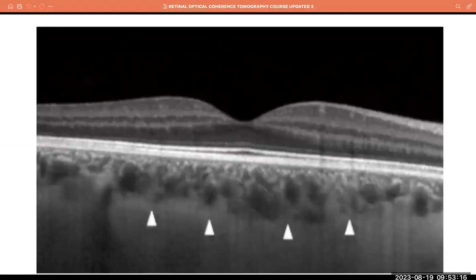It contains the energy house of the photoreceptor. So if this line is missing, you're sure to a good extent that the vision in the patient would be poor. It's more like the photoreceptors might be there, but they are not energized. That's the powerhouse of the photoreceptor.